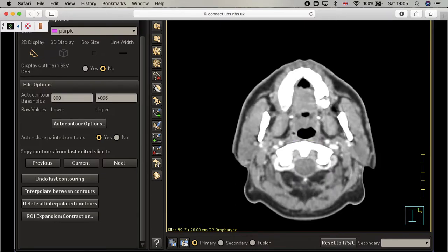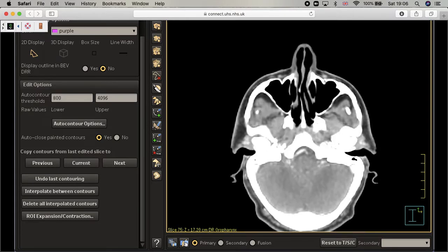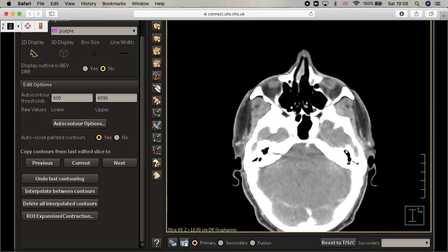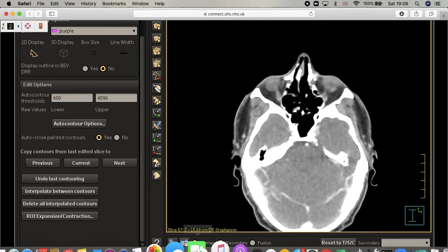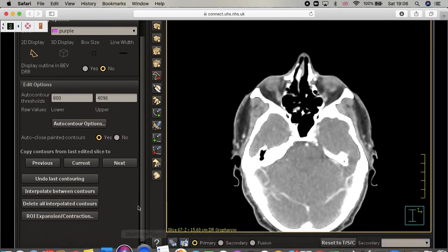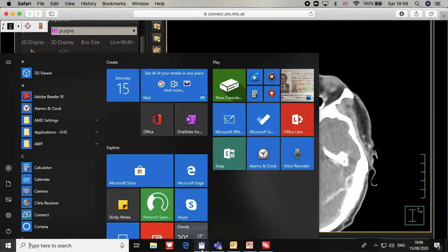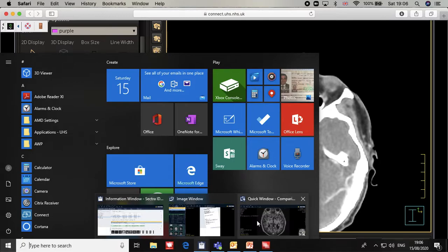One structure that we didn't talk about in the brain is on the MRI. If you still have some effort, I can go to the MRI and show you the hippocampus, because the hippocampus is also very important in the brain. And if you're dealing with brain patients, I think it will be useful to know how to draw the hippocampus.